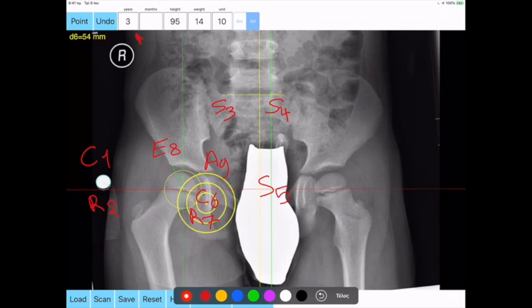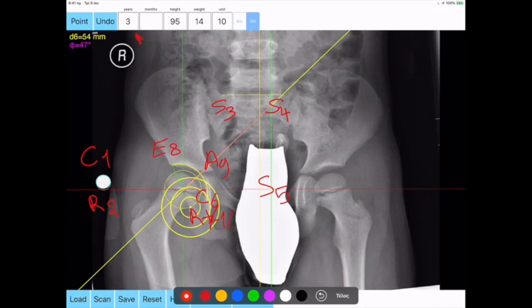In the same manner you mark the V10 point which is the lowest and most lateral point on the acetabular teardrop, and subsequently you mark the point where the lower contour of the head intersects the postero-inferior acetabular margin, point D11. By using the circular template of transparent circles, you then try to fit the best of circles to the two distant sites of the canal and remain at the center of the canal of the neck of the femur. By pressing the button point the center of the canal is located, C12.